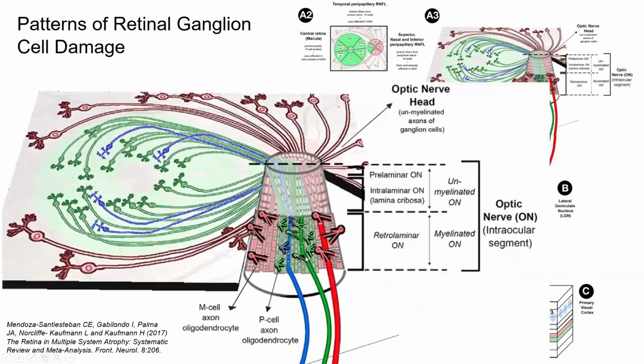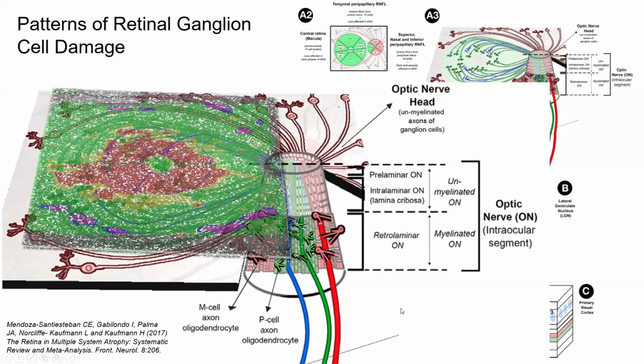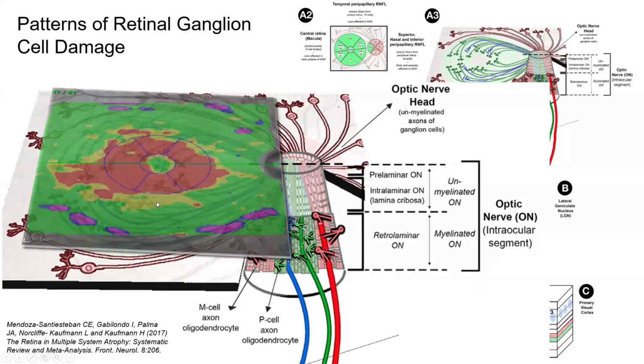When we look more in detail in the center and do an overlay with our deviation maps of the macula, we are able to see pronounced thinning of the ganglion cells and are able, by correlating it with the region of atrophy, to say which kind of ganglion cells might be damaged and get a hint towards the underlying disease.